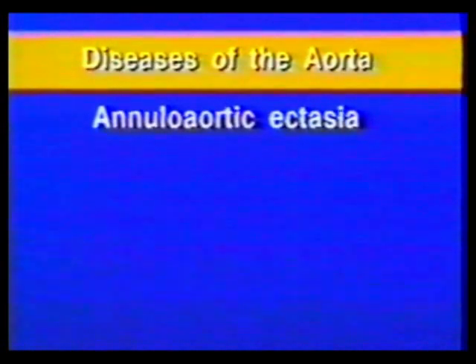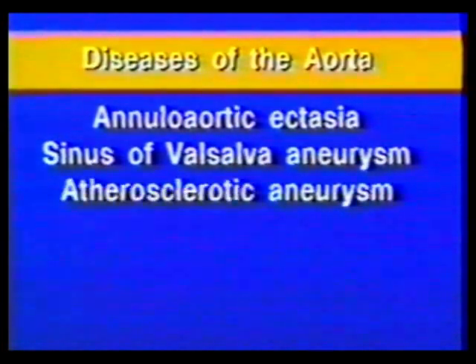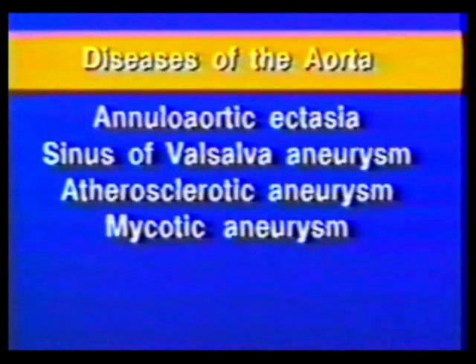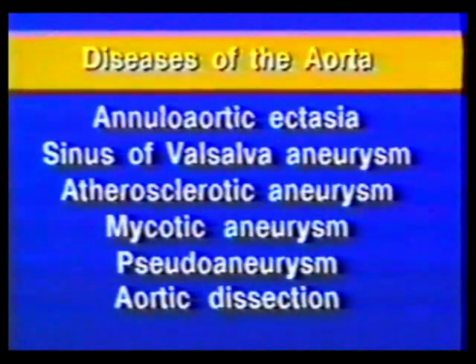The diseases of the aorta which we will illustrate include annulo-aortic ectasia, sinus of Valsalva aneurysm, atherosclerotic aneurysms, aortic mycotic aneurysms, pseudoaneurysms, and aortic dissection.